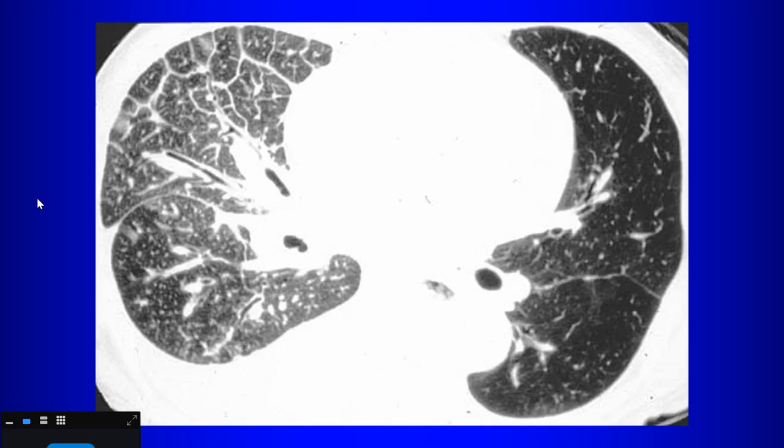So here is the CT scan on this patient. Is this pulmonary edema? No. Why not? I'm looking at it and it's a little irregular, a little thick. What do you call these? Oh, micronodular opacities. Those are all nodules, right? And there are nodules here too. So you do have interlobular septal thickening. It's somewhat irregular, but you have all of these nodules, right?